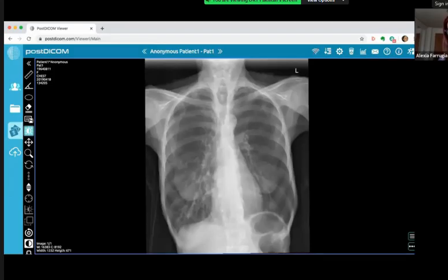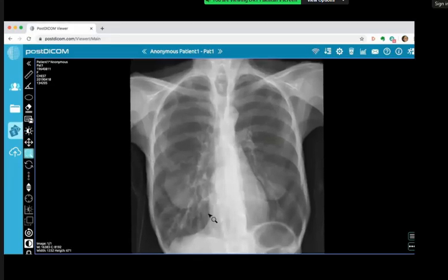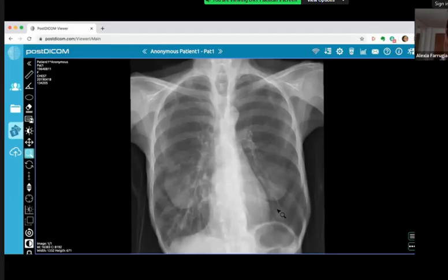Do you notice anything in particular in the lung parenchyma on the right side? So there's some loss of markings in the left upper and mid zones, in the left lung. Mid and lower zones in particular? There's increased shadowing. There's possibly some nodules. There's a nodule, I think, in the left lower zone that I can see. Are you referring to this one? Yeah. Okay.